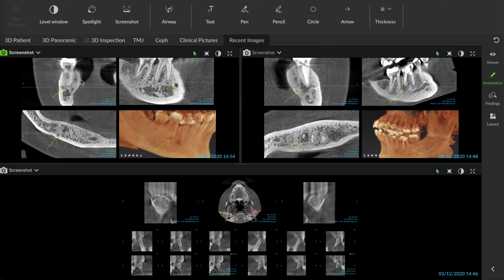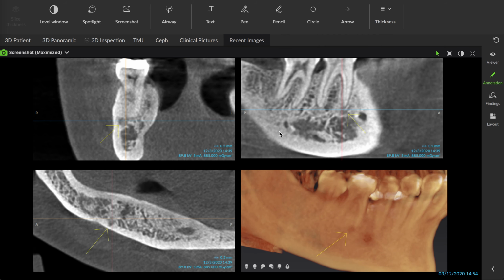Most of her symptoms were on the right side. As you can see from these snapshots here, we have some widening of the periodontal ligament space and some nondescript bone destruction in there. And this is what really helped her get a feel for what was going on in her mouth. I had to explain to her that this is normal anatomy, this is the mental foramen, but this window in the bone there is an abscess that we can see manifest here, which is related to this tooth.